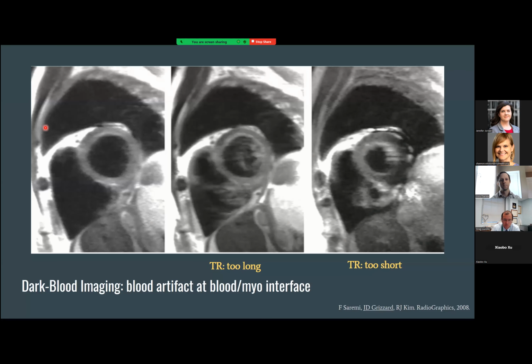So that you've got, like here, I think that it was on this slide. So if it's too long, you'll have the flow. So it's a little tricky to visually say based on these images, is it too long or too short? But one thing you'll notice is the signal intensity here in the fat areas. That can be a tip.